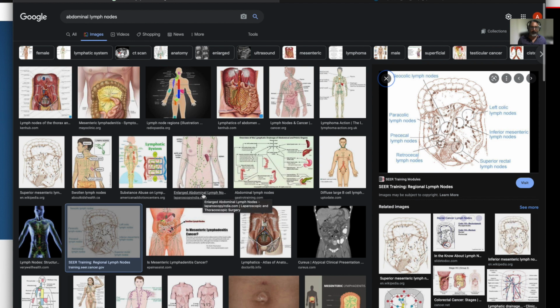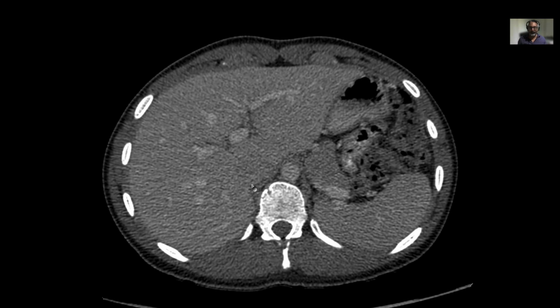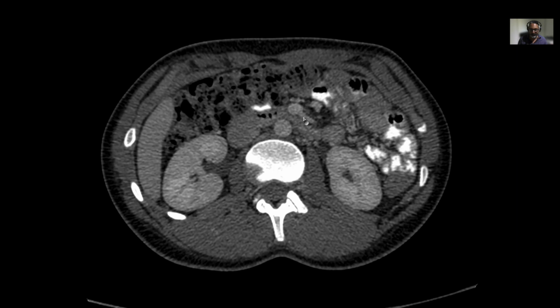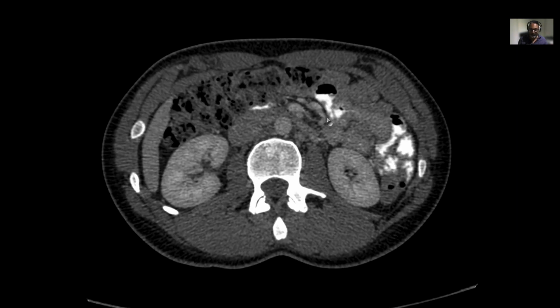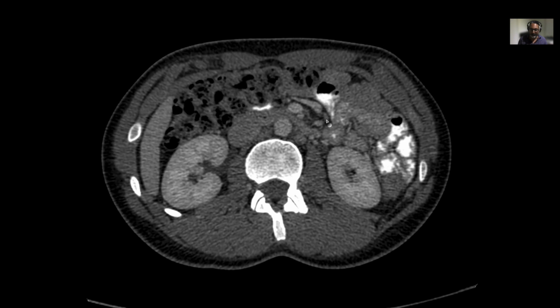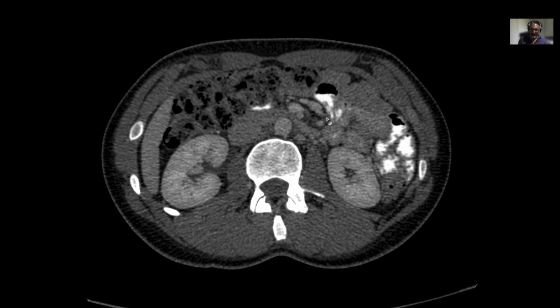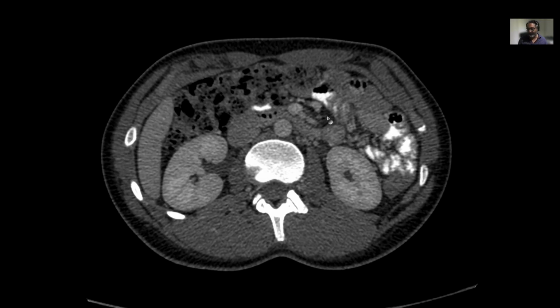And so how would you tell in the abdomen then? In the abdomen, how you would tell is that, let's go down here. Now you see that there's a lot of mesentery here. If you look at any structure here, if it follows and you see it connecting, that's a blood vessel. But if you see some other structure that sort of pops up, like that one, and then vanishes. Did you see that one? Popped up and then it vanished. Now that could be a lymph node. And there are many lymph nodes like that in the abdomen.